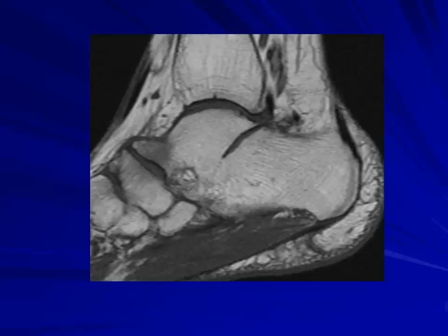No, the thing is, if there is any intervention, do you talk about fusion? Congenital is coalition. Basically, if you talk about tarsal metatarsal coalition, coalition is fusion. But when you're talking about post-surgical, then you say there is incomplete fusion, partial fusion, or complete fusion. If you say partial fusion, then you have to describe what part of the fusion is complete and what part is incomplete, because that is the most important.